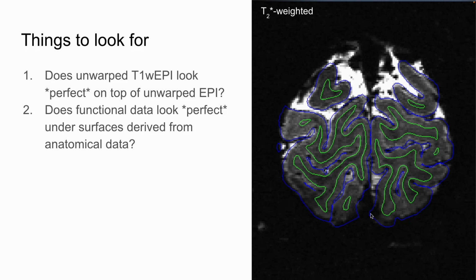This is where the segmentation, for whatever reason, I didn't have a T2 weighted image as part of this. You can refine the pial surface segmentation with the T2, and for whatever reason on this anatomy, I didn't even include that. So here the segmentation has failed and is grabbing part of the sagittal sinus itself. So not only is my signal dropping out, but my segmentation is failing down here. So a person should not draw any conclusions about any analyses that are done here.